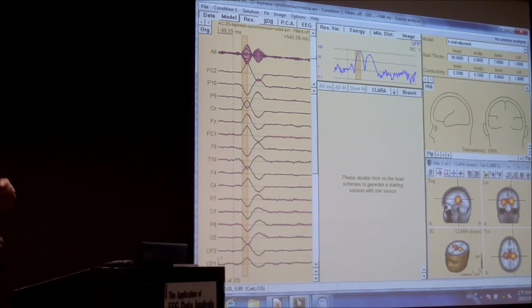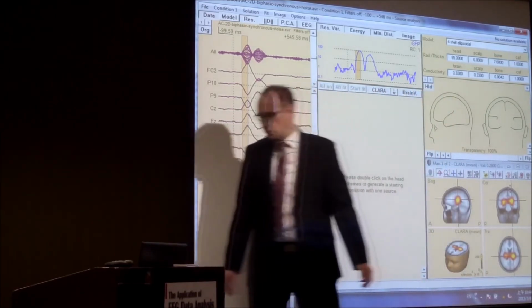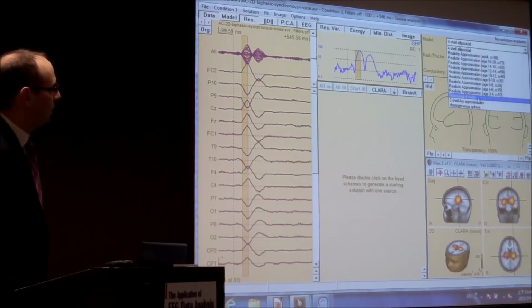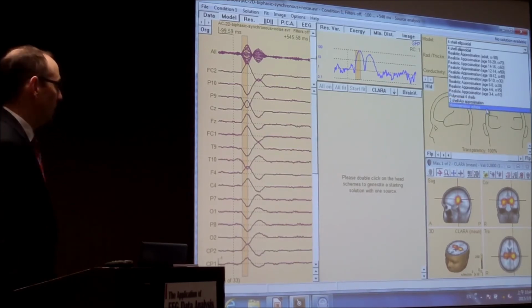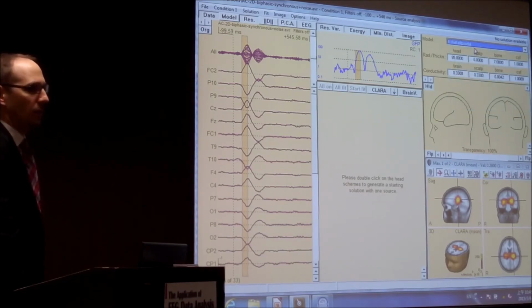Okay, this is just giving you a short impression. Now what you see here is a standard brain. That's another individual anatomy. You can certainly choose between different kinds of head models here. We have a realistic approximation for different ages. We have a 4-shell model, 3-shell model, or homogeneous sphere, which is basically a sphere with one conductivity value, or the 4-shell ellipsoid. We really like this one. It's a good head model, but the best would be to have the individual anatomy.